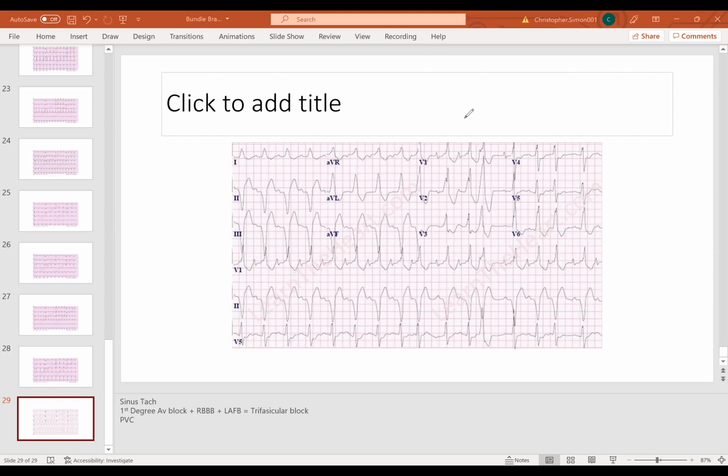And we have a little moment of irregularity over here too. Right there. See where that got irregular just for a second? So just remember, guys, because EKG is a measurement of time, what happens here and here and here and here and here happened at the same time, just in different camera angles. So what happens here and here, or here and here, did not happen at the same time.